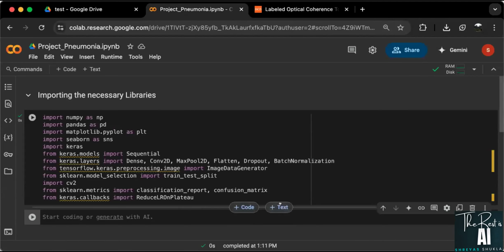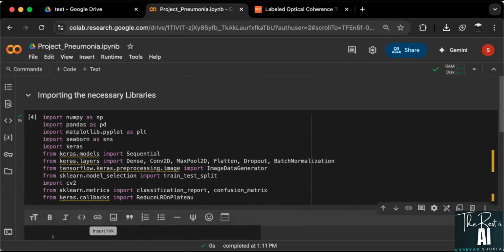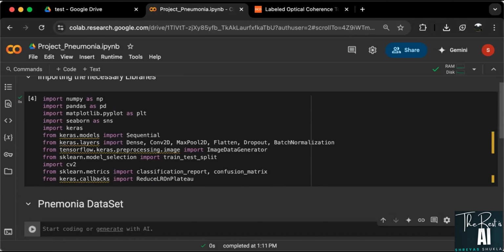I'll start with giving a heading. Our task here, the thing that I'm trying to do here, is to take those images, grab them and convert them into NumPy arrays. NumPy arrays obviously we'll have to convert, because for people who do not know, our model only works on numbers, and so we have to find a way to convert all our images to NumPy arrays.